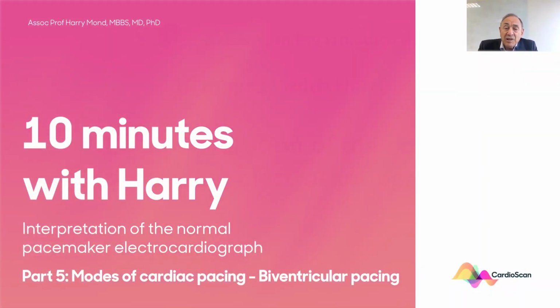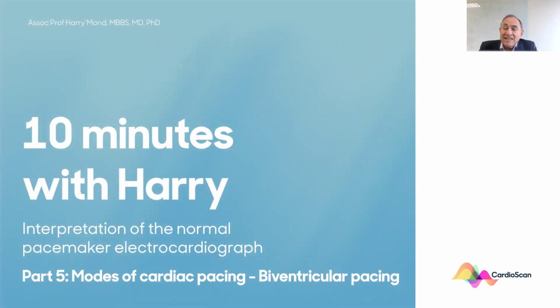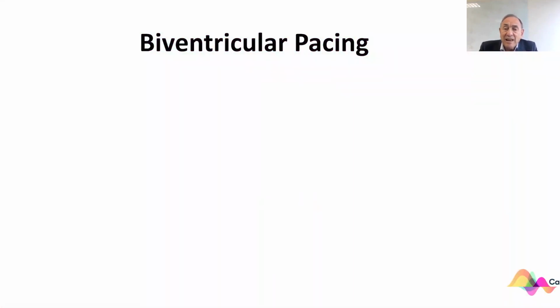We are currently having a series on the interpretation of the normal pacemaker electrocardiogram. And today, number 5, we'll be talking about biventricular pacing. In order to understand biventricular pacing, I have to go back and explain some of the reasons for why we do it, and then we will look at the electrocardiograms.